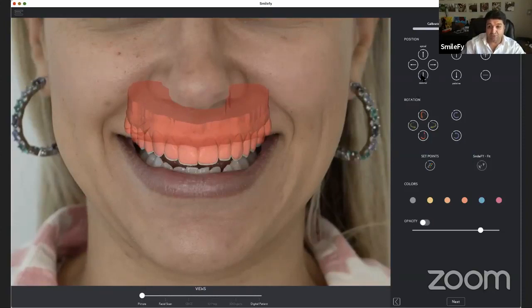Please consider also the fact that the pictures are distorted depending on what lens and cameras you use. Because I'm gonna create the mock-up for the anteriors, I'm gonna make sure that canine to canine is calibrated properly. As you can see, if we match the posteriors, for example, with the picture, then our anteriors don't match anymore. That's because of the distortion of the picture.